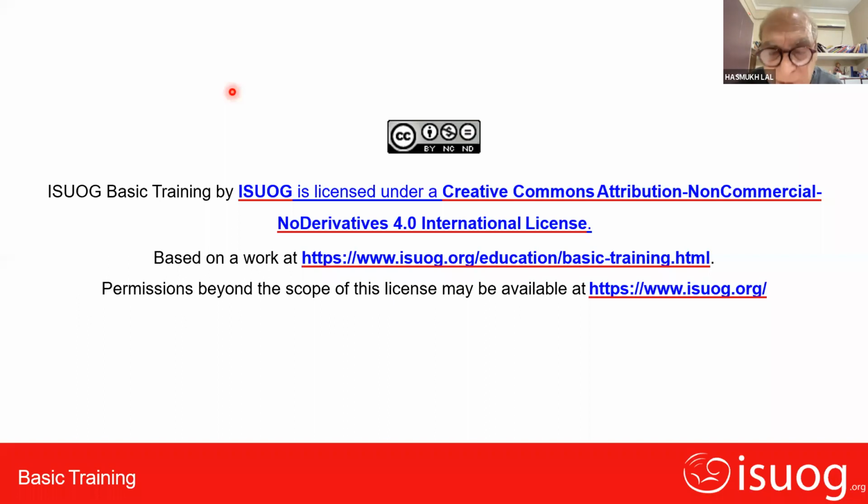And the final one, the 24th one, is we will show you a lot of images and ask you whether this is normal or not normal. Making a decision, that's what we have to make. And of course, it is very important that when we look at an image, we know these are standard biometric planes and how they look normally.